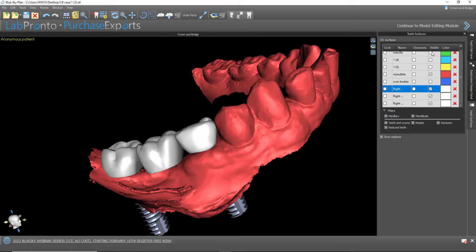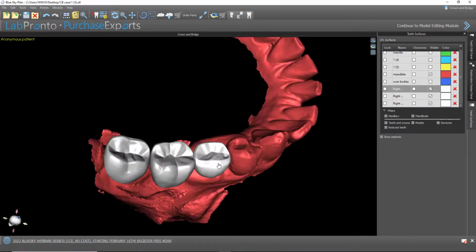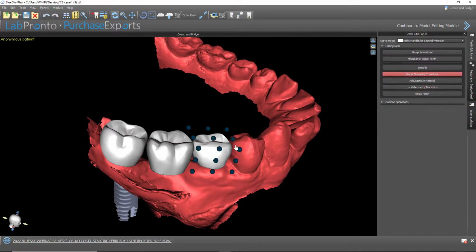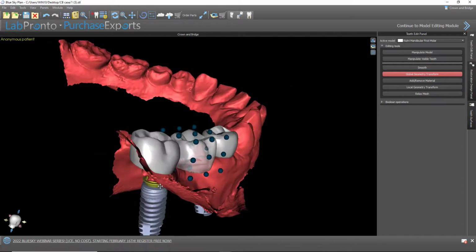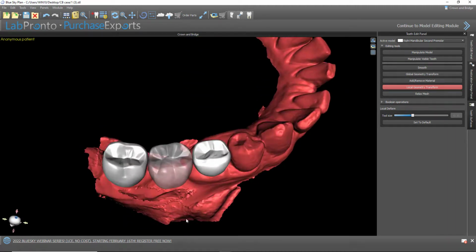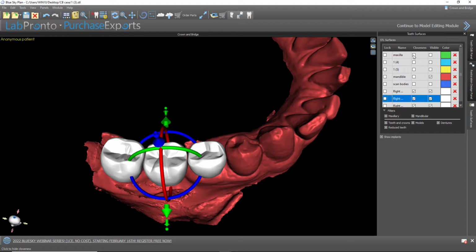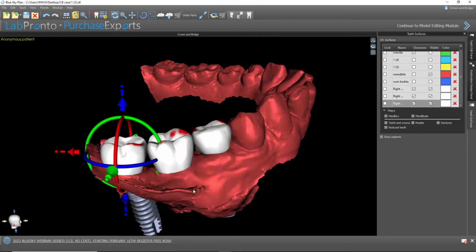Okay, let's turn off. And again, we could work on improving the design of these. What I could also do is activate the closeness checkbox for the teeth and for the opposing arch. And here we could see our points of contact.